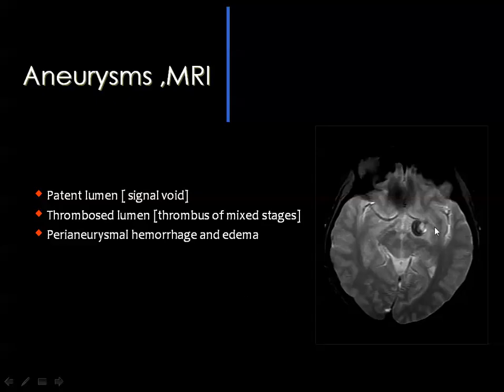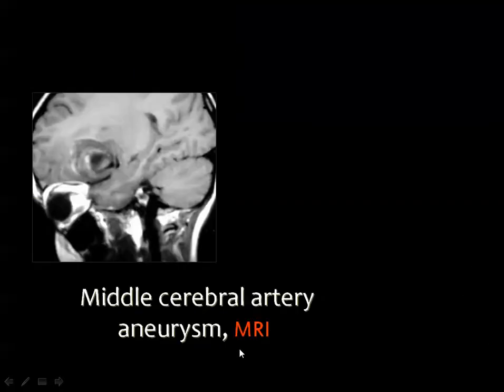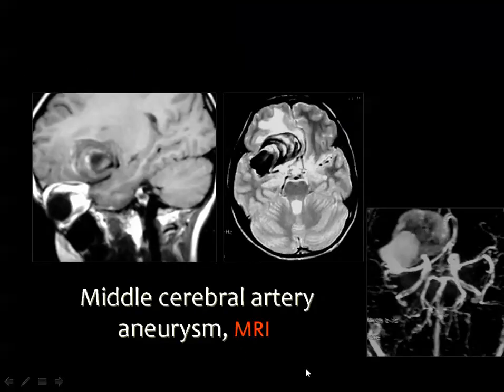Then you will see a well-defined lesion, which is usually signal void along the course of one of the vessels, showing a characteristic whorly appearance, which is due to turbulence of flow inside the aneurysm. And this is the classic appearance of the aneurysm, especially seen in the T2 weighted image. And you can see these artifacts which are due to the turbulence of flow inside the aneurysm, and this is a pointing point for the diagnosis of the lesion as an aneurysm.